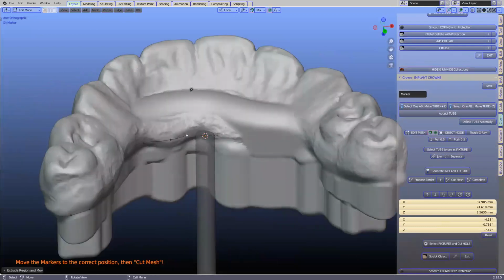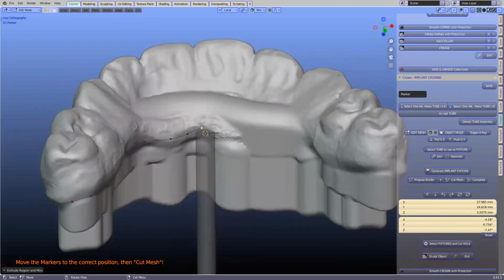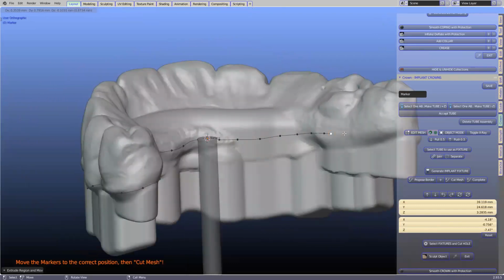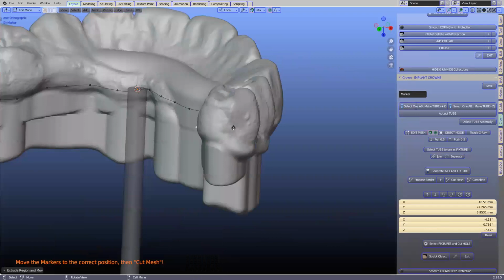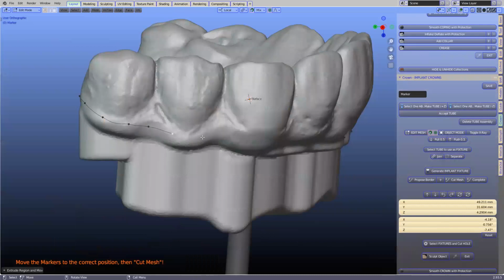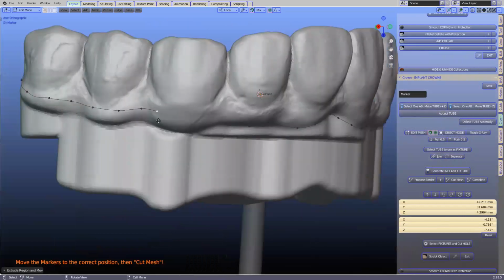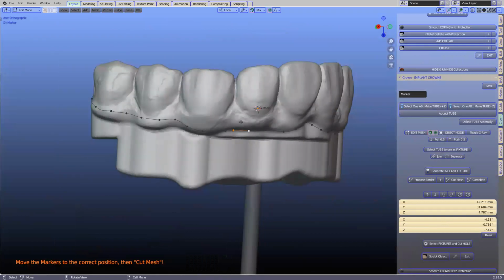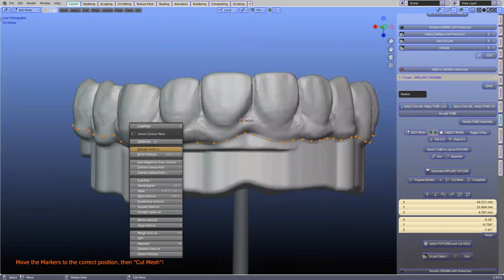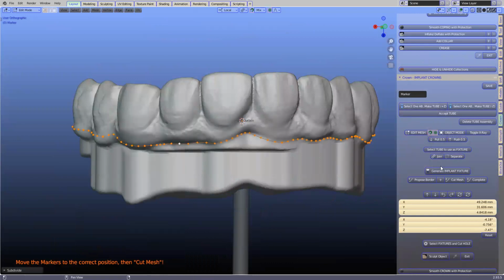Here you can see how that's actually unified where the bar runs through it to make sure that we've got adequate thickness for the bar. Okay, let's take this all the way. Maybe a bit lower there. Okay, let's join it up. I'll probably subdivide it one time just to make sure. Subdivide like this.